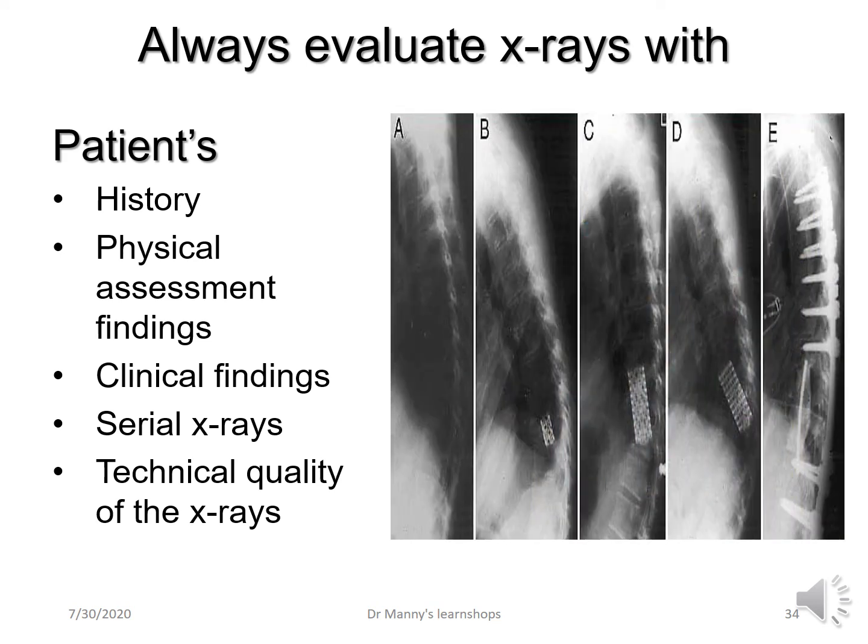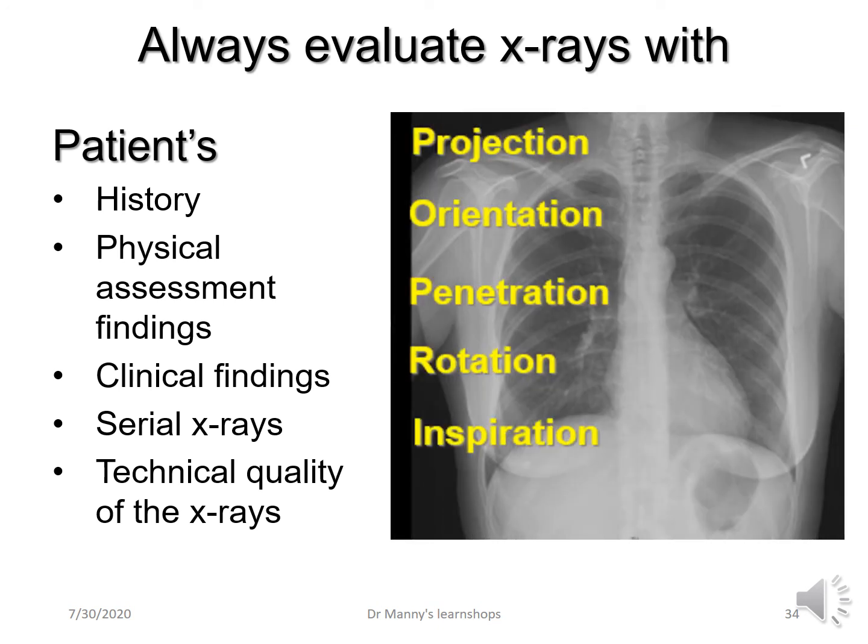If possible, review the chest X-rays serially, because things may have changed over time, acute versus chronic. And always remember the technical quality, especially with the congenital cardiac anomalies.